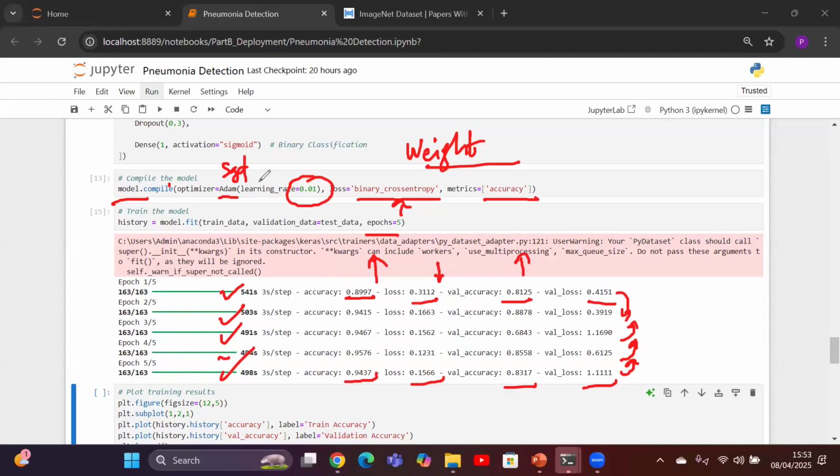So this particular optimizer is a method that helps improve performance. Basically, the optimum aim is reducing error. As we mentioned in scikit-learn, our aim is to reduce the error of the function, basically reducing the cost function. These errors are measured using a loss function, which tells how far the model prediction is from the correct answers. So our aim is to minimize the error over time. We can say that time versus error has to be reduced.